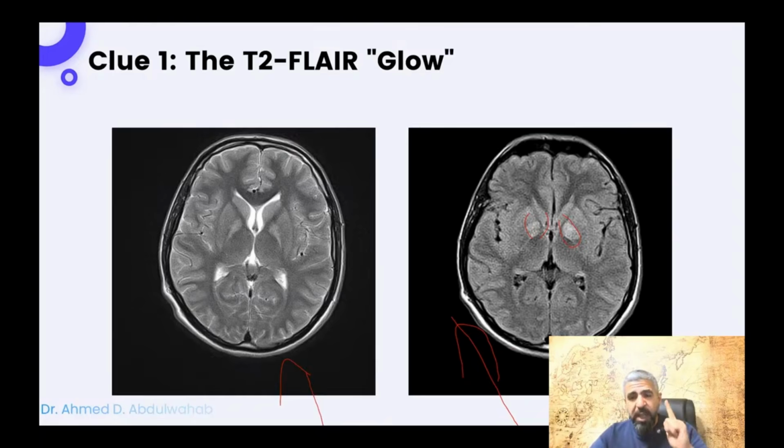It is only in the globus pallidus. The putamen is not involved. The thalamus is not involved. The thalamus is good and normal. Just the globus pallidus is involved. Does drug overdose do this, or is it something else?